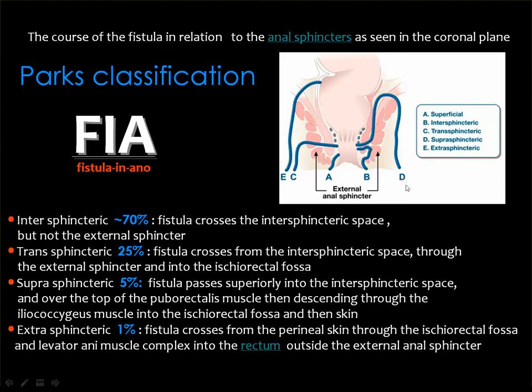Then we have the extrasphincteric, which is a fistula tract connecting the skin to the rectum. It has no relation to the anal canal.